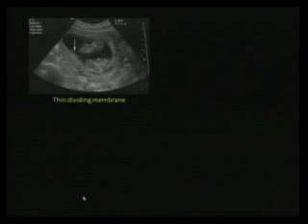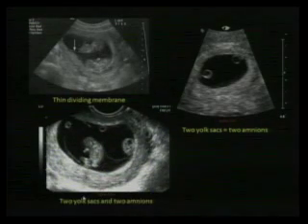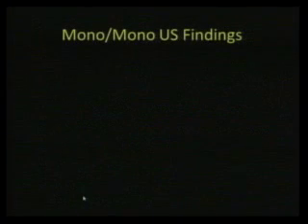So here we have one gestational sac. Here's that thin dividing membrane, and there's only one placenta. Another example here, here's two yolk sacs. Here we don't actually see that thin amnion, but there are two amnions, we just can't see them because those membranes are so thin. Here, yolk sac, amnion, amnion. So here, each twin, they're together, but they each have their own sac. So that's good.